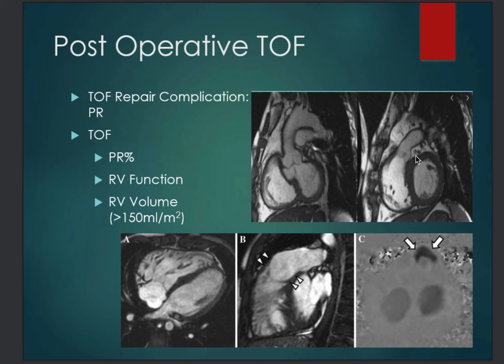The second point is, sometimes we would be able to see the fat around the coronaries, and here the LAD, the left anterior descending, is it close or not close to the landing zone of the stent, in order not to crush the LAD between the stent in the pulmonary area and the aorta, or the left ventricle on the left side. So it's important to comment whether there is sufficient fat and sufficient distance between the LAD and the pulmonary.